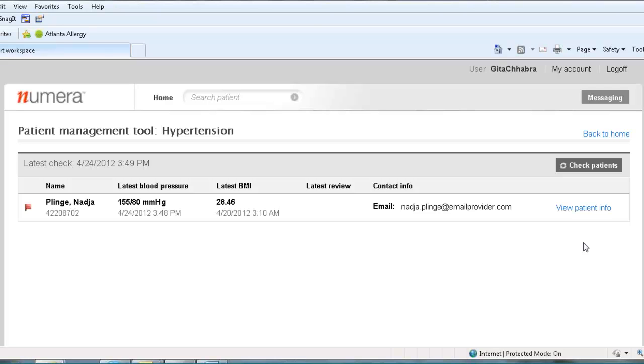And then, if you want a care team working on the same set of patients, it is very convenient for them to use this tool to manage them. And actually, this is for hypertension, but similarly, there could be one for diabetes or COPD, etc.